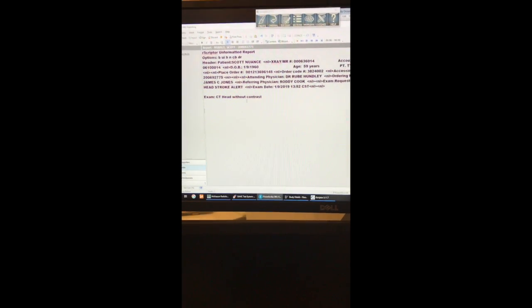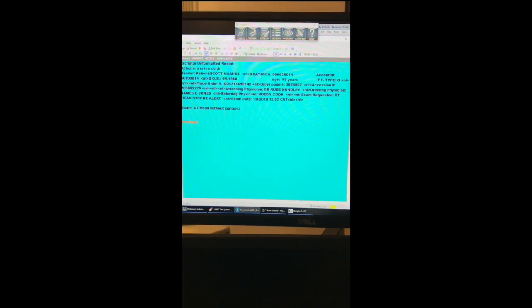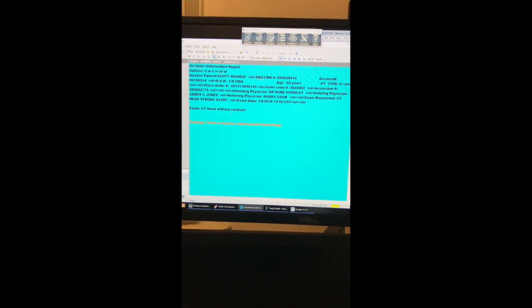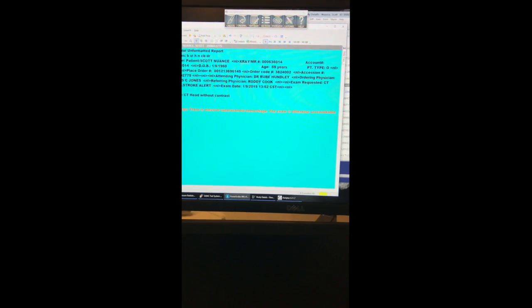this is what we're talking about, narrative or structured reports. If I do something like findings, there is massive subarachnoid hemorrhage, period. The exam is otherwise unremarkable. New paragraph, impression, subarachnoid hemorrhage, period, paragraph, recommendations, urgent neurosurgical consultation, period.